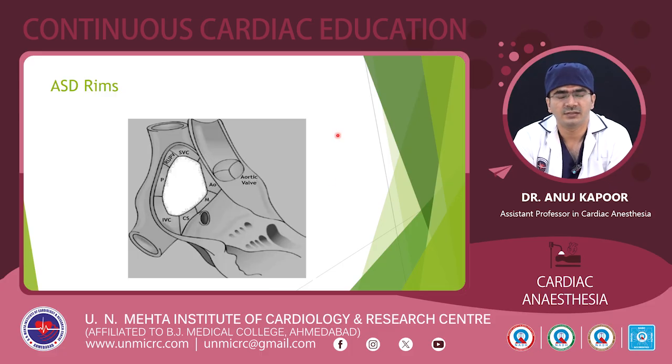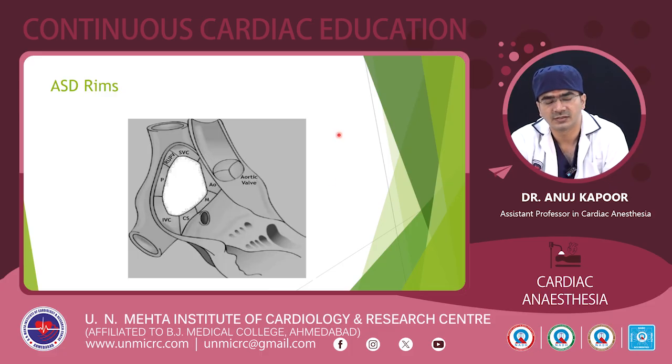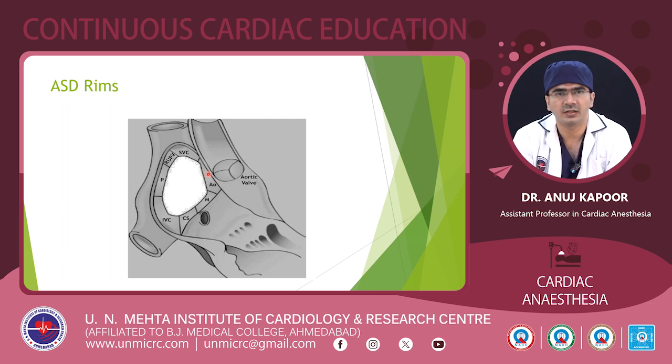Now proceeding forwards, we will look at what the rims for an ASD are. These rims are important for evaluation while doing a device closure for the ASD. We name them anatomically, and as we can see, there is an aortic rim, there is a mitral or AV rim, then there is a coronary sinus rim, there is an IVC rim, there is a posterior rim, there is an RUPV rim, and then there is an SVC rim.